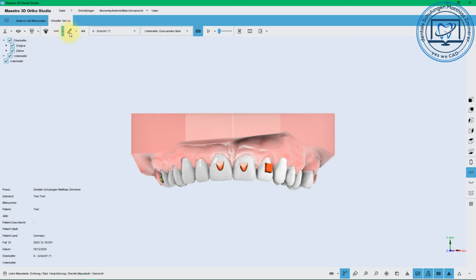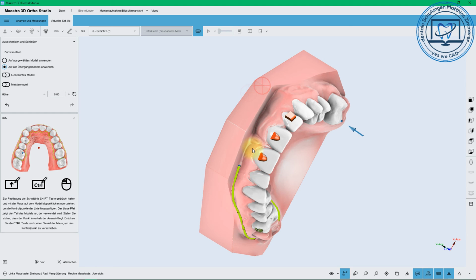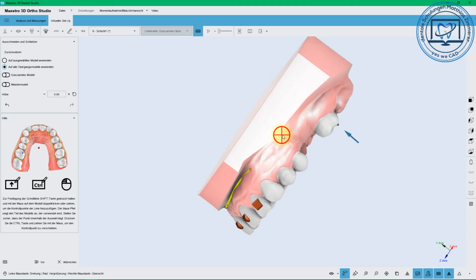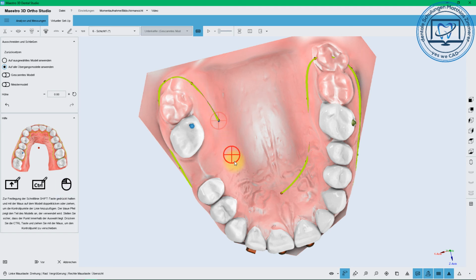In the next step, we have the possibilities to make jaw models for the aligner folds, and there are two options. The first is we draw a curve where we want the model to end. This is the one option. The second option is to do this with a plane, but not always is the plane good enough.